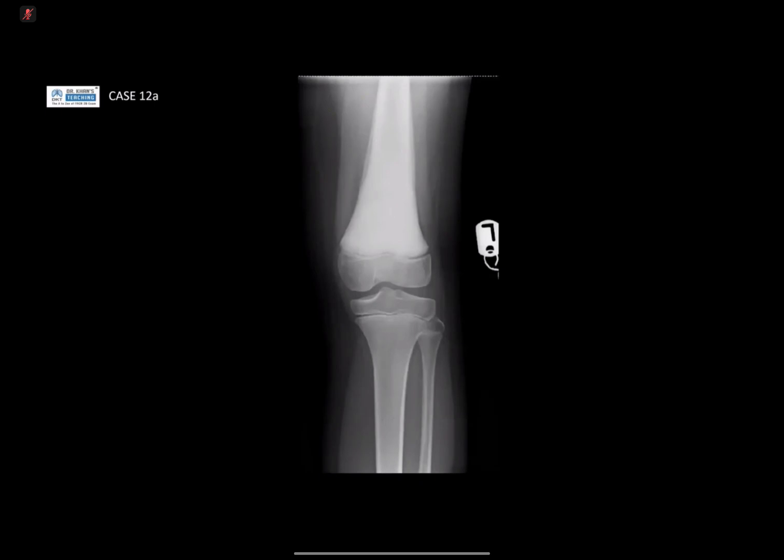So based on this sclerosis of the metadiaphyseal region, my differentials would be... Can I stop you and just think about whether you can see any aggressive or non-aggressive features on the film? I'm not able to differentiate whether this is a lucency beneath the cortex or a periosteal reaction. So I would say it is a periosteal reaction, and attribute it to an aggressive feature of the lesion.